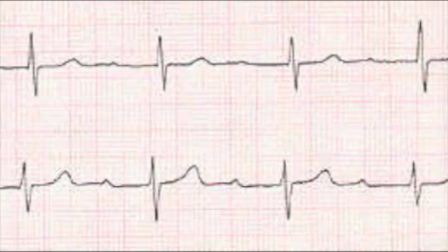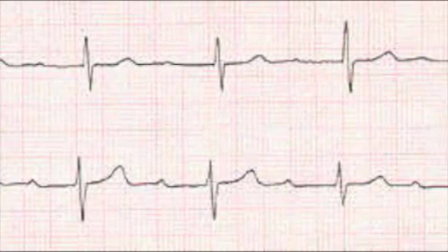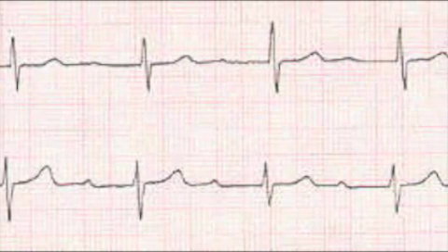Now we get into the AV blocks. This is first degree AV block. You can see that the PR interval is very long, longer than 0.2 seconds.